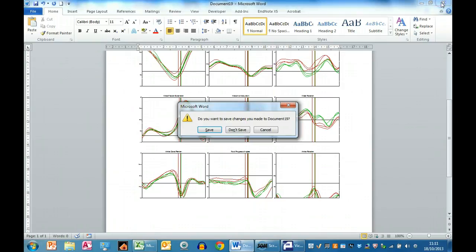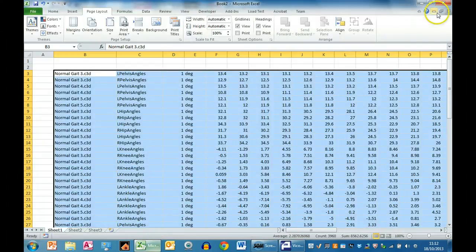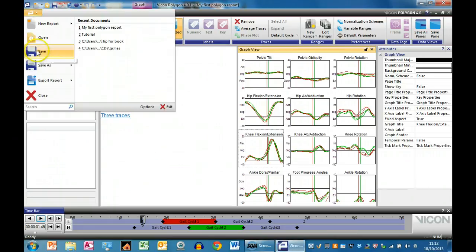So I'll close that down. No real need to save it. I'll close Excel down. No real need to save it. And just bring you back to the Polygon report. I'm going to save that once more.